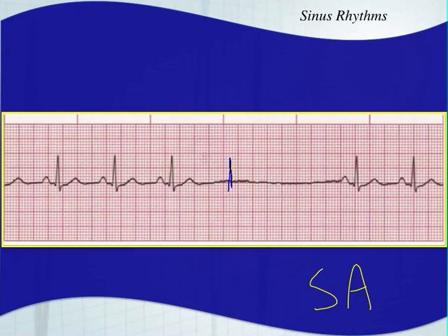Sinus arrest. All right? Now, when we start getting into all the other different types of arrhythmias, you're going to see that these are going to become harder to identify amongst everything else that you learn. But just remember that there's no P wave, there's no non-conducted P wave in here. Everything is missing, and it does not continue the normal rhythm.